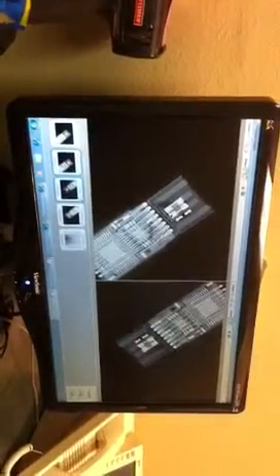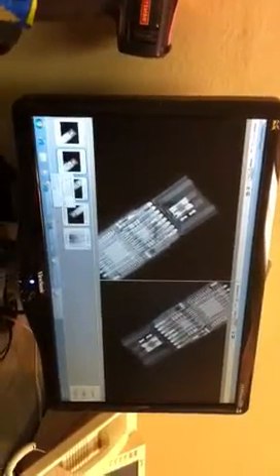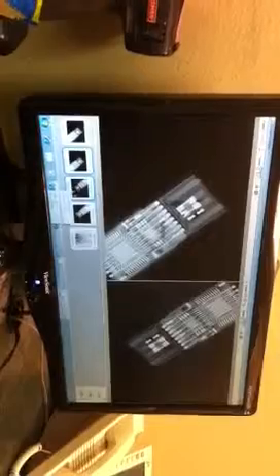That's side by side comparative view. Okay? So it opens up those 2 images. It shows you which 2 images. You see the blue border around the 2 images? Let's say you want to switch one of the images out for this image.